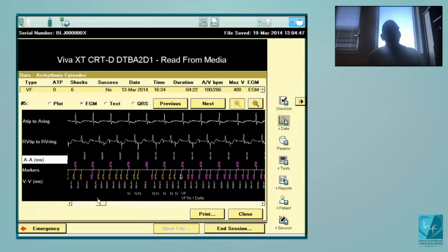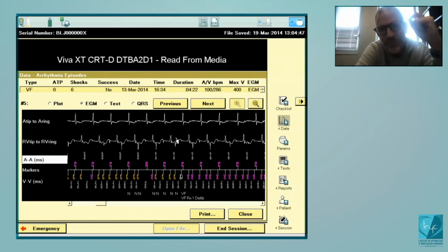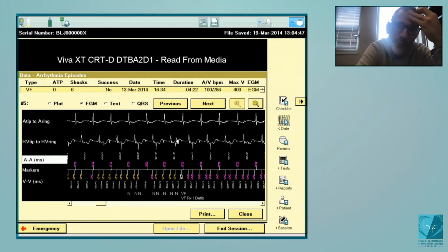There. Okay, you see here, obviously the signals that you see are unphysiological, and that was a problem with a lead failure, for sure. I show you this tracing, but you see the marker N. There is an algorithm which is designed to avoid inappropriate therapies in case of lead dysfunction. We're going to rediscuss it in another tracing, but as I said before, the one about T-wave oversensing is working pretty well. I've not seen any inappropriate therapy on T-wave oversensing since we programmed this algorithm.